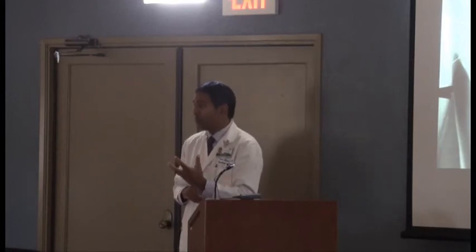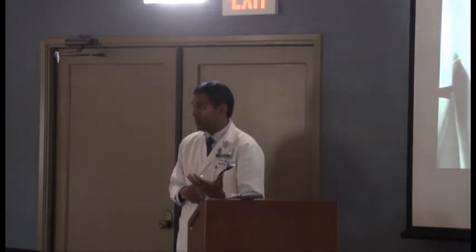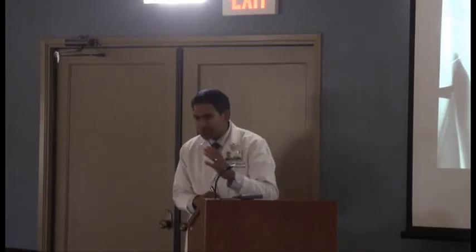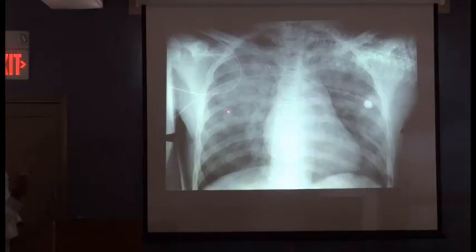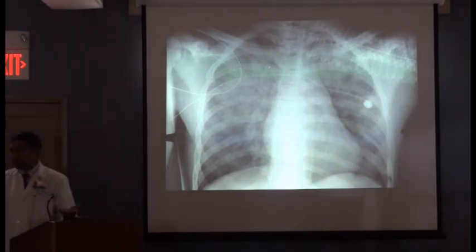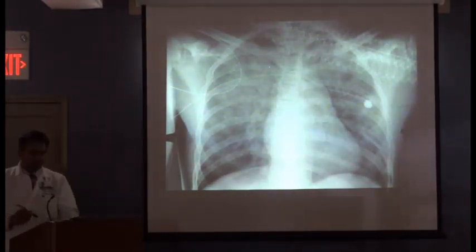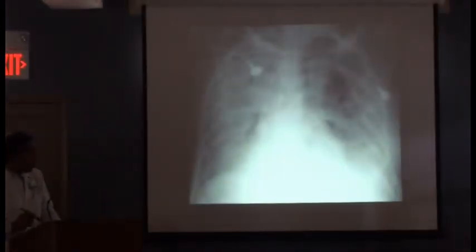Good, and therefore, what can congestive heart failure do? Yeah, you can get some pulmonary edema. Do we see any evidence of that in the chest x-ray? Absolutely, excellent, guys. You see how this is all kind of edematous? This is fluffy. The vascular markings are bigger than it should be. Right? That's a classic pulmonary edema, especially the fact that you've got this huge heart. That's exactly right. All right.